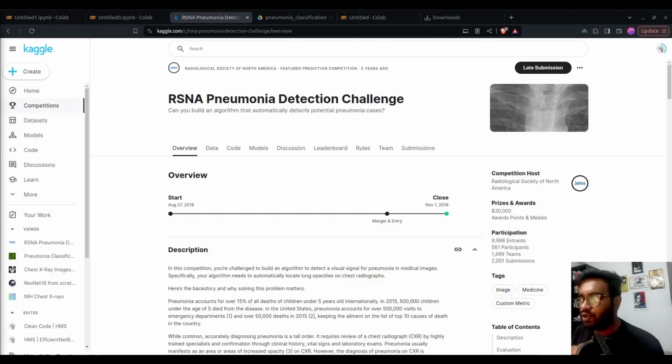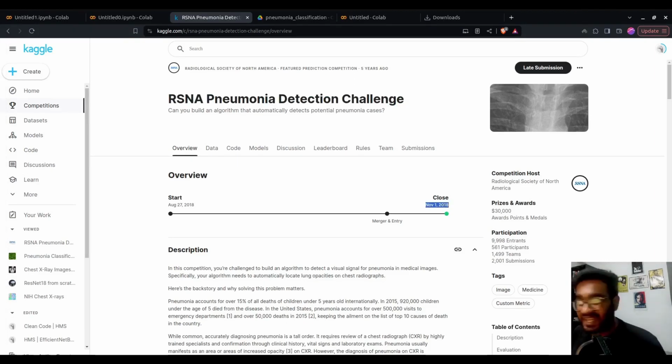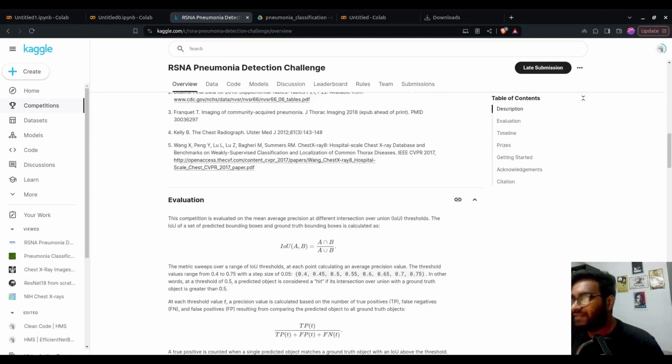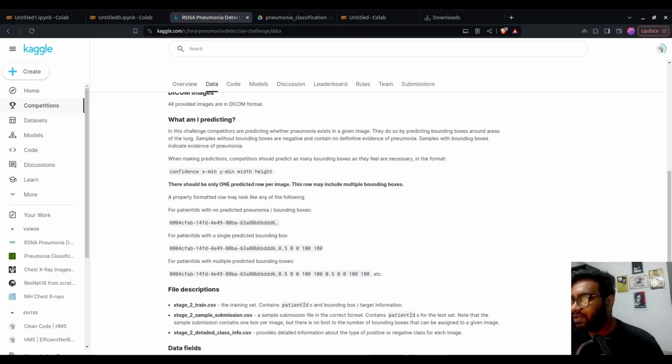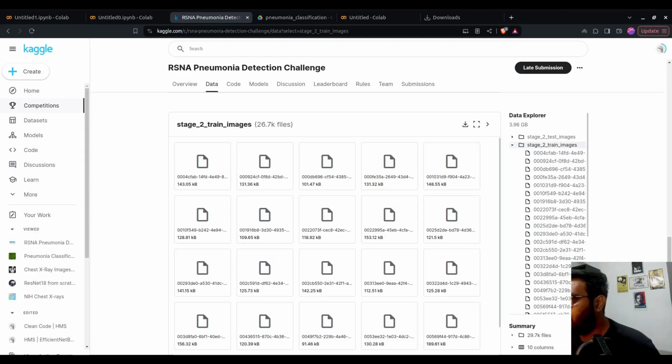So in this video, we're going to first download the dataset. I have downloaded the dataset from this challenge called RSNA Pneumonia Detection Challenge, and it was done in November 2018. Okay, so you can download the dataset from here. You can see a data tab. If you come below, then you can see download all. Over here, we have the train labels as well as the images of our dataset that we need.